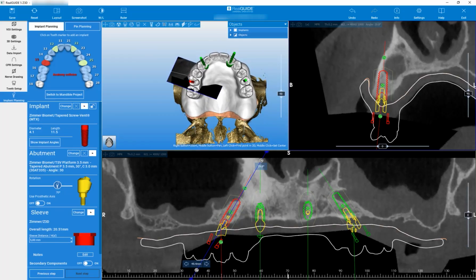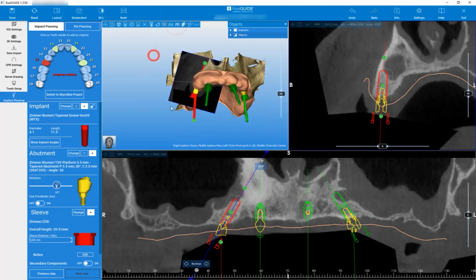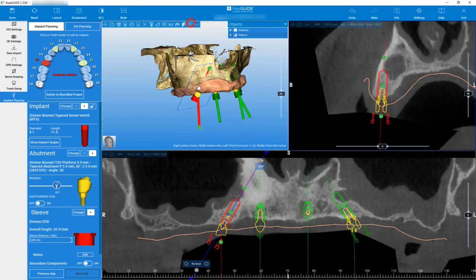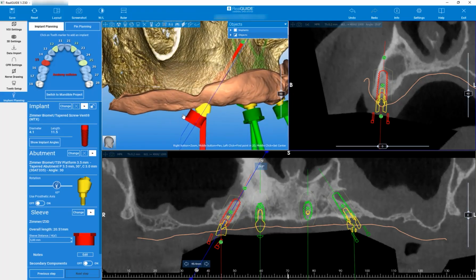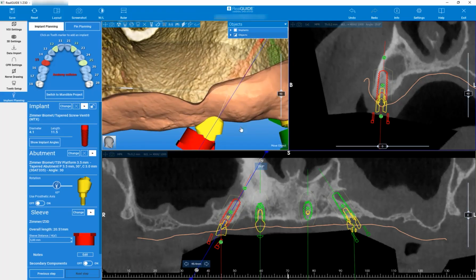Another important tool we can see identified on the tooth chart is anatomy collision. This means that the sleeve is likely touching the STL of the model, identifying the soft tissue anatomy for the patient. Depending on what is registered to the case, this could be a soft tissue model or the intaglio surface of the denture prosthesis.